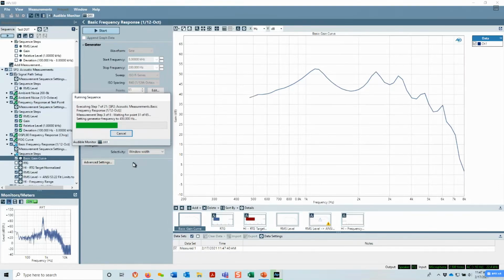These are the ANSI limits. I'll try to remember to come back to those, but someone can remind me if I forget.